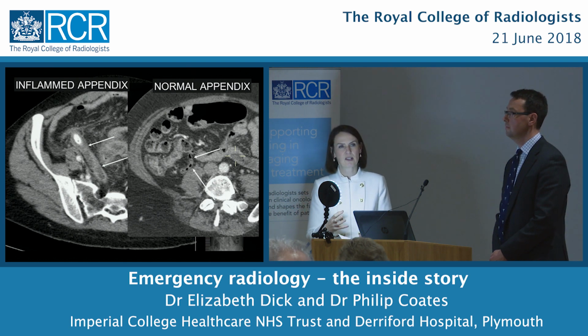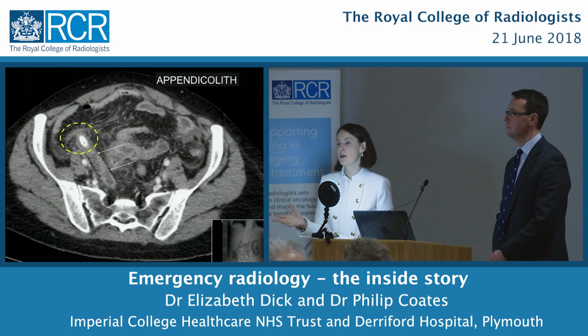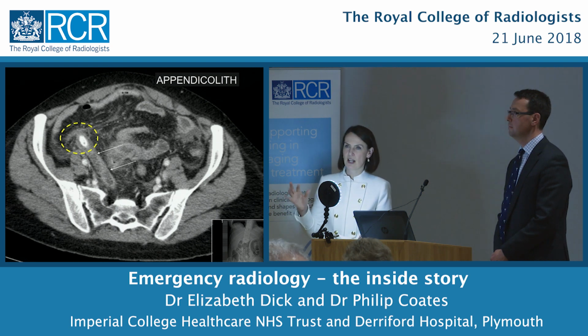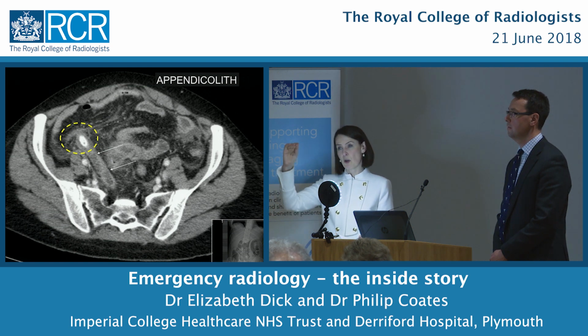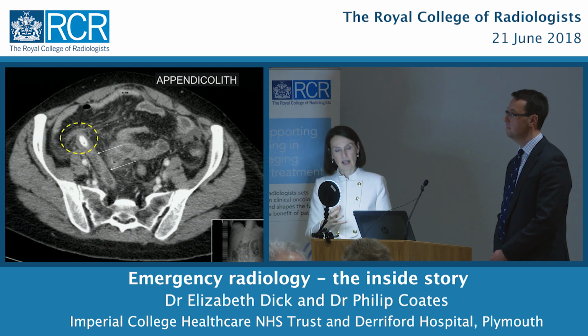That's not the end of what the surgeon wants to know from us. They want more details. So it's interesting to know why the patient might have developed appendicitis. You can see here this kind of stone, an appendicolith. This stone is in the top end of the appendix, and it probably blocked everything in the appendix and caused all the inflammation to occur. And those are quite common in people with appendicitis.